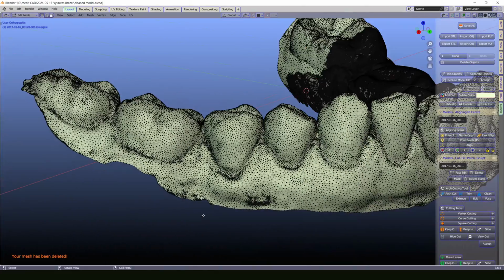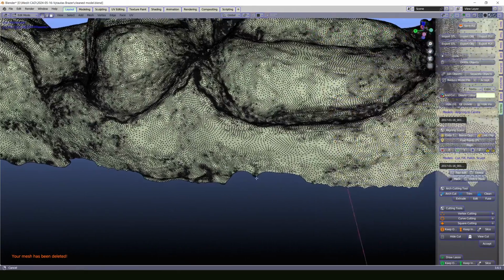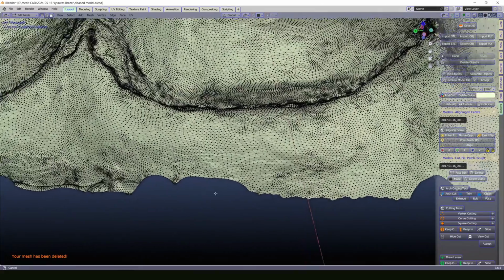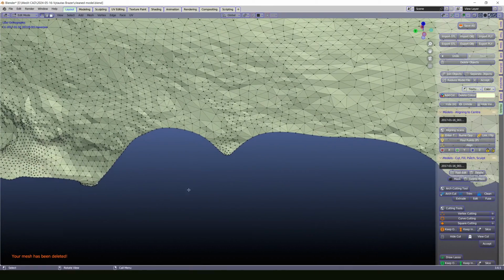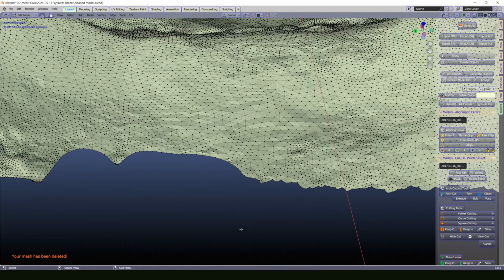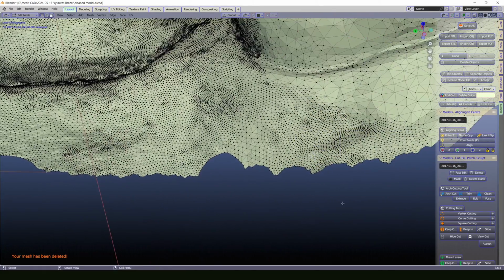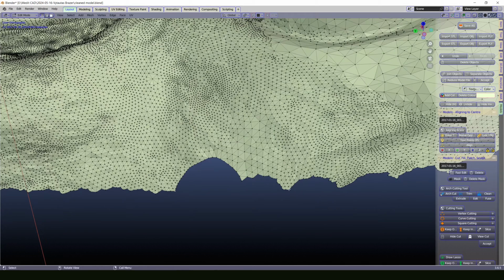I think that on this particular lower jaw model, maybe I'll bridge here so it will look better. One point here, another point here, the F button. One point here, another here, the shift button, yes, it's bridged.